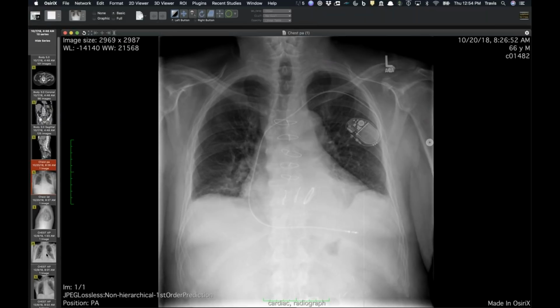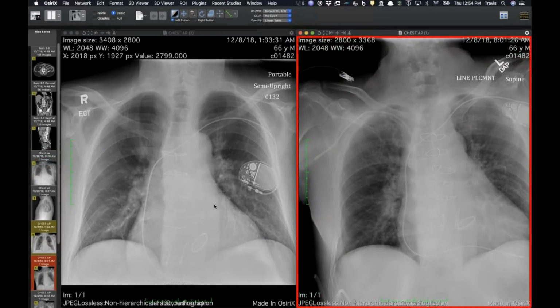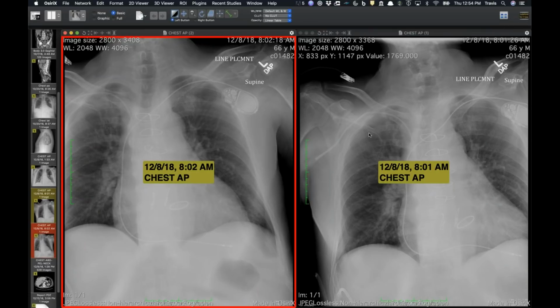And this one, glad I get to show this one. Let me see. So this is a patient who had an aortic valve replacement in the remote past. And let's see, there are two radiographs here. I'll show you these radiographs, and I'll let you look at them, because as you see, they are a minute apart from each other.